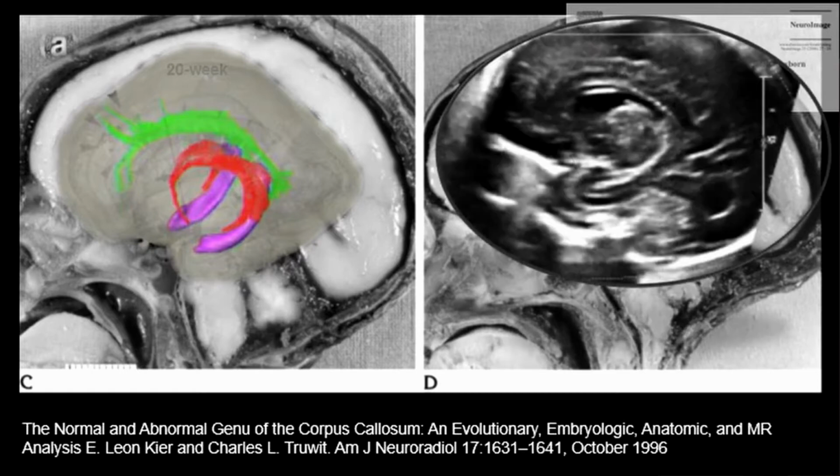understanding as we continue to now develop more and more techniques related to our fetal imaging, where here we have a very nice hippocampal gyrus coming up. The fornix split and went a little higher and then is going to come down and back. So it cannot stay in the same plane. We must manipulate our volume and our slices to identify.